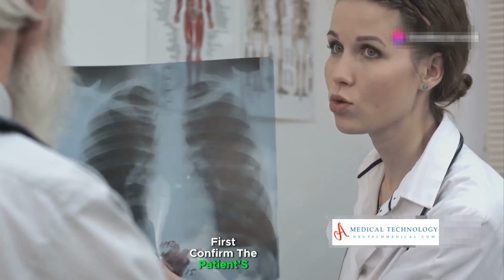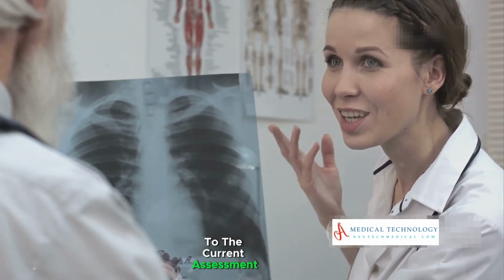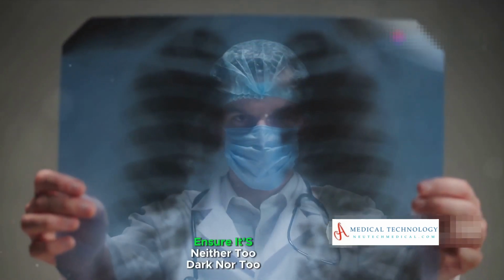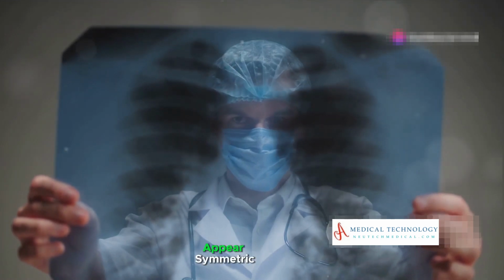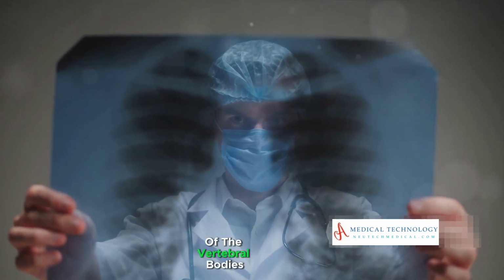First, confirm the patient's identity and the date of the X-ray to ensure its relevance to the current assessment. Next, assess the quality of the X-ray. Ensure it's neither too dark nor too light and that the patient was in the correct position. Both clavicles should appear symmetric, and the spinous processes should align with the middle of the vertebral bodies.